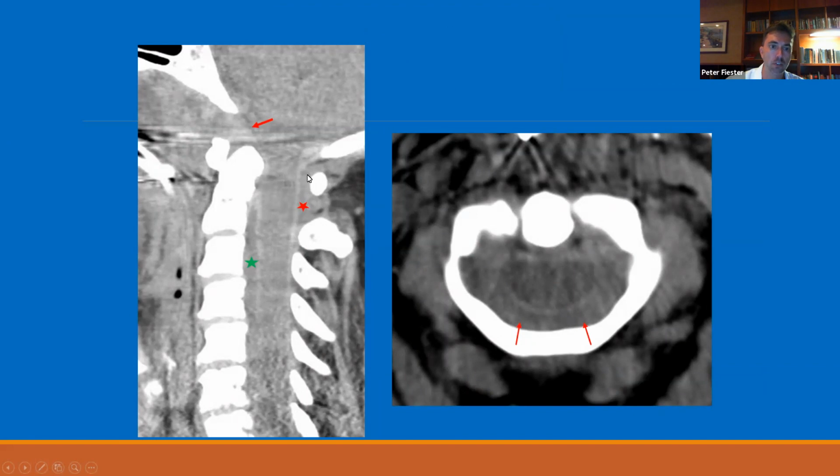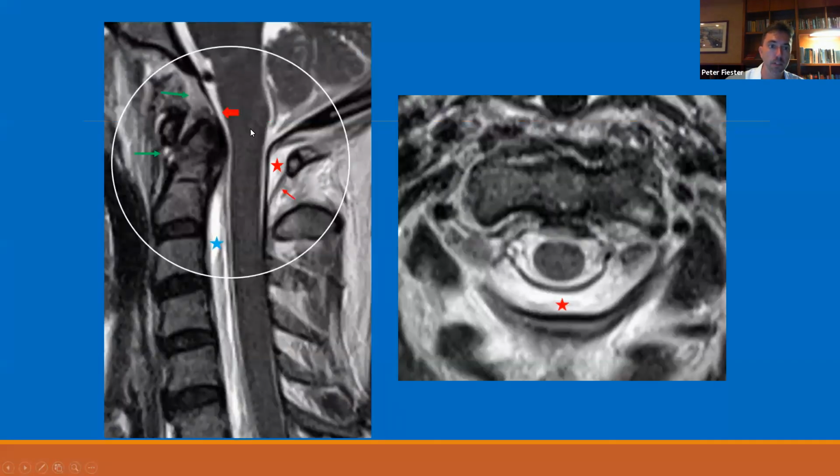You have a dorsal epidural hematoma at C1-2, and then you have a ventral hematoma or effusion, I guess. I mean, probably a mixture of blood and fluid here. And when you look on the axial, you can see how the dorsal thecal sac is displaced anteriorly. And it just again shows that, when you look at the MRI, this patient has all these cervical ligament tears.